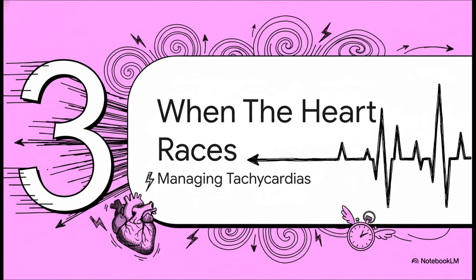All right, so we've covered a heart that's basically not beating. Now let's flip the script and talk about one that's beating way too fast. Let's dive into the tachycardias.